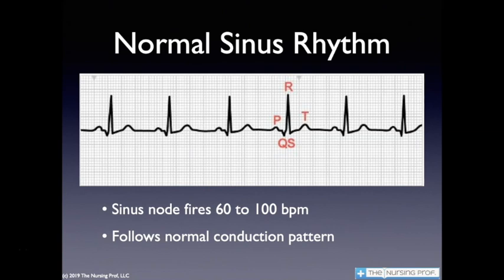So then let's take a look at some of the rhythms and talk about how we're going to use our 5 steps to find the difference in these rhythms. The first step is looking to find the rate.